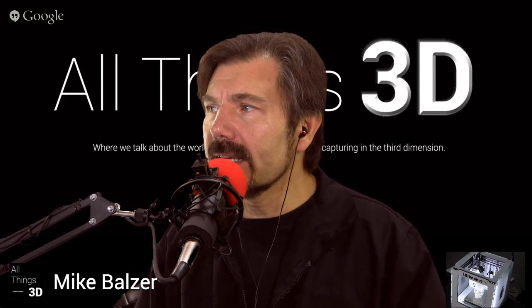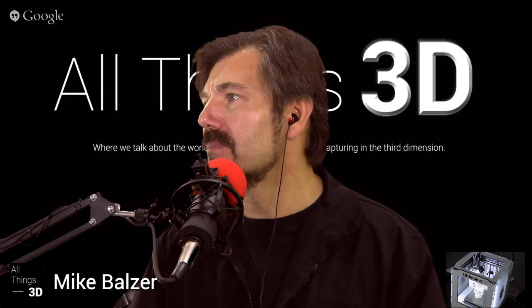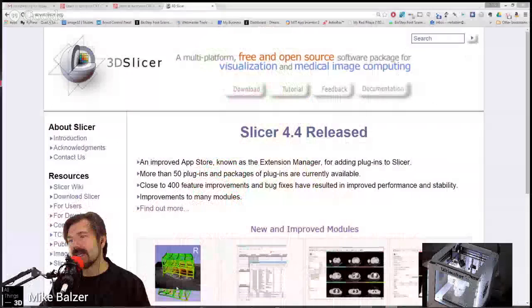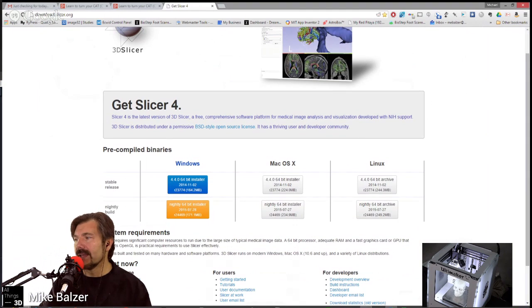So I'd like to bring up that tool right now so that you'll get an idea of where we're going with this. I've actually had the gentleman, Stephen Piper, who's the project lead behind this, and it's called 3D Slicer. Currently they're on Slicer 4.4, which I think has a date of November of 2014. But if you click on the download, you'll find that they have several nightly builds, and this is the one that we're going to be working with today.